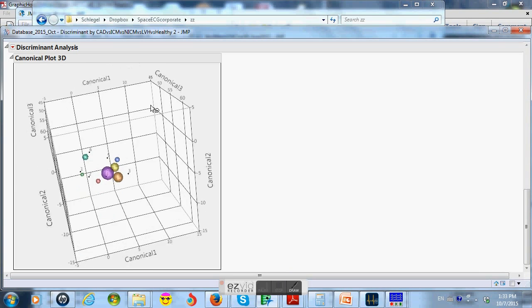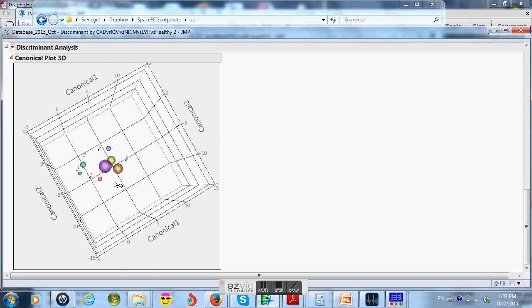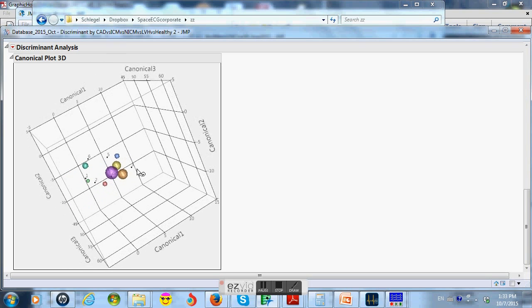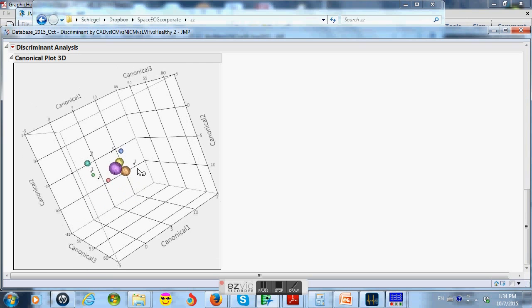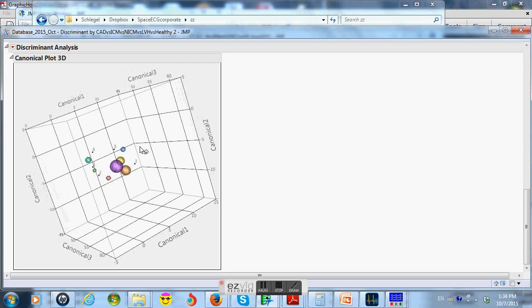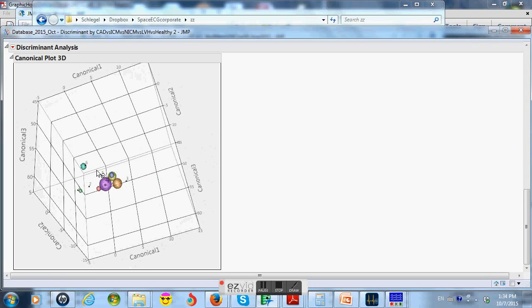Here we're going to go and look at things three-dimensionally at the same plot, basically. And this is real fun. Sometimes you can get a little deceived by the two-dimension, but if we look, number 1 ends up orbiting the healthy planet. Number 2, the coronary disease planet. Number 3 is actually closest to non-ischemic cardiomyopathy. Number 4 is smack in the middle of the left ventricular hypertrophy or left ventricular electrical remodeling circular sphere.